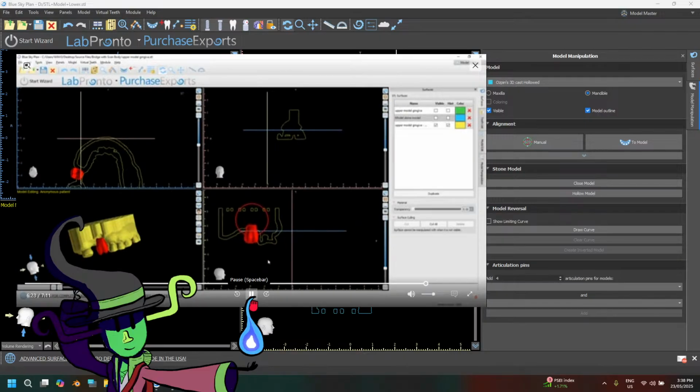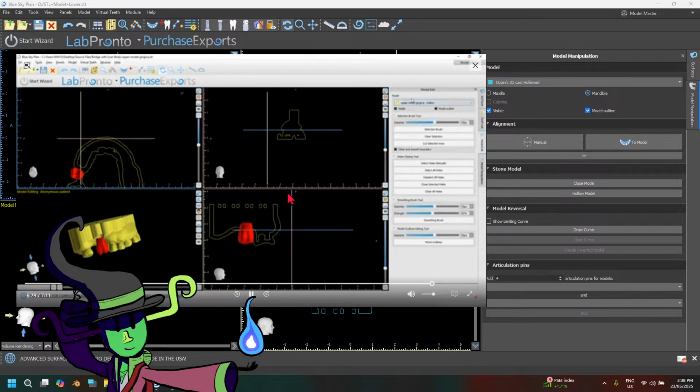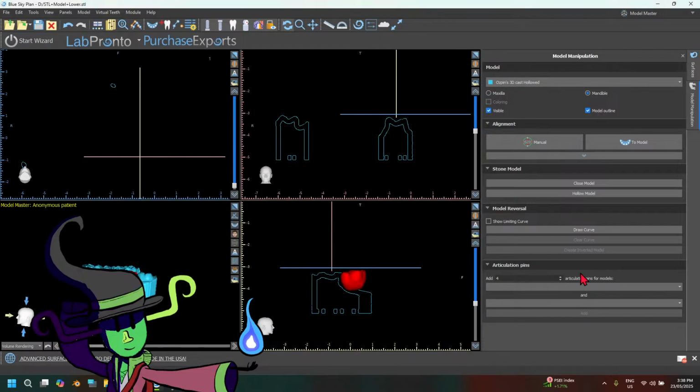Slices as well. And what we're going to do is we're going to select the relevant model. In our model edit, select the model, and click move outlines. Hold down the shift. I can't move outlines here. Is it maybe here? No. Nope.